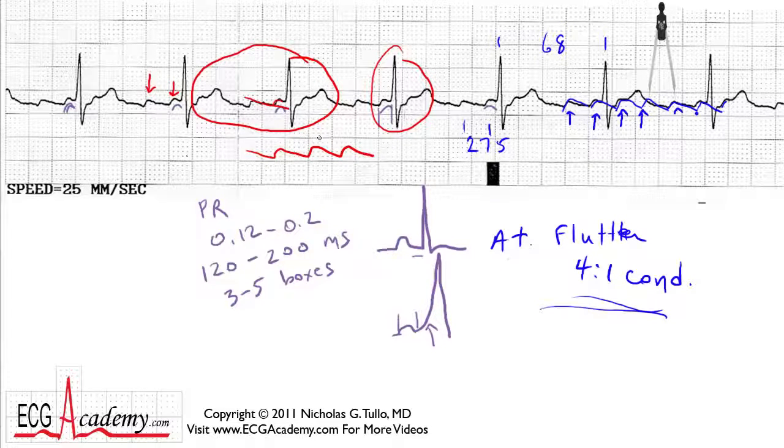Some people would just call this a moderate ventricular response, but these flutter waves are a little bit tougher to see. It's fairly basic. Most people should be able to pick those up, but 2 of them got hidden by the T wave, and that's why I thought this strip was a little bit more challenging than the ones you'll normally see. So that's Rhythm Chalk Talk number 5.